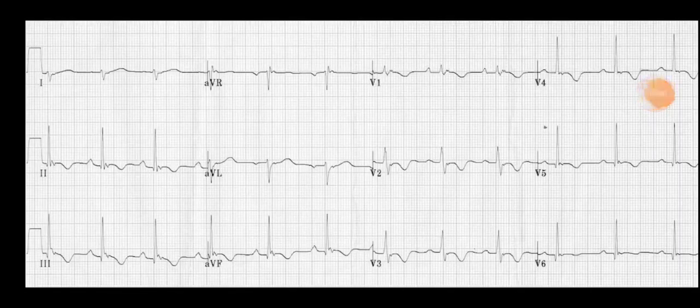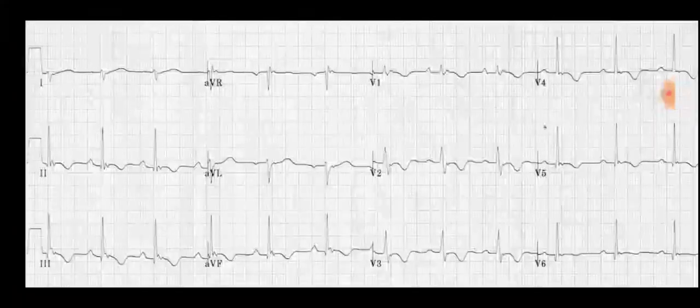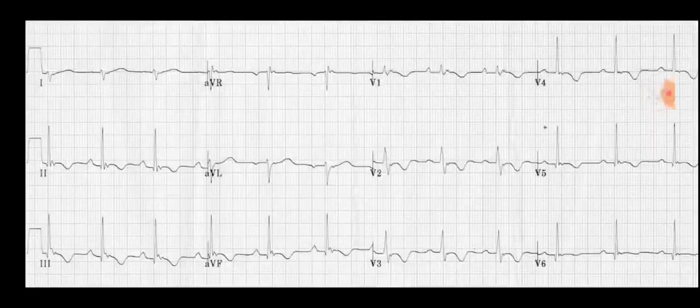This ECG is an example of ARVC. Just focus on the QRS complex duration in leads V1 to V3, and then in other leads like V4 to V6 and the limb leads. So it's evident that the QRS complex is broader in leads V1 to V3.